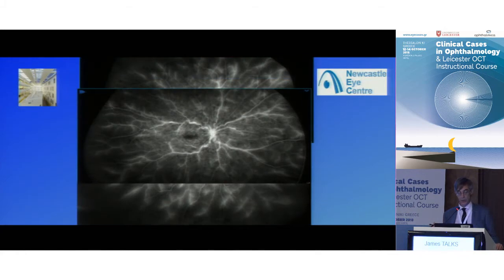And that is what a fluorescein will look like with an acute central retinal vein occlusion. All the vessels are feathery. So they're leaking, which is what you'd expect, but they haven't gone. So they're not infarcted, but they're just leaky. So it isn't that ischemic. So it never was that ischemic. We've got rid of the leak, but it wasn't an ischemic eye in the first place, but it did have an ischemic macula in the first place, and that's remained.